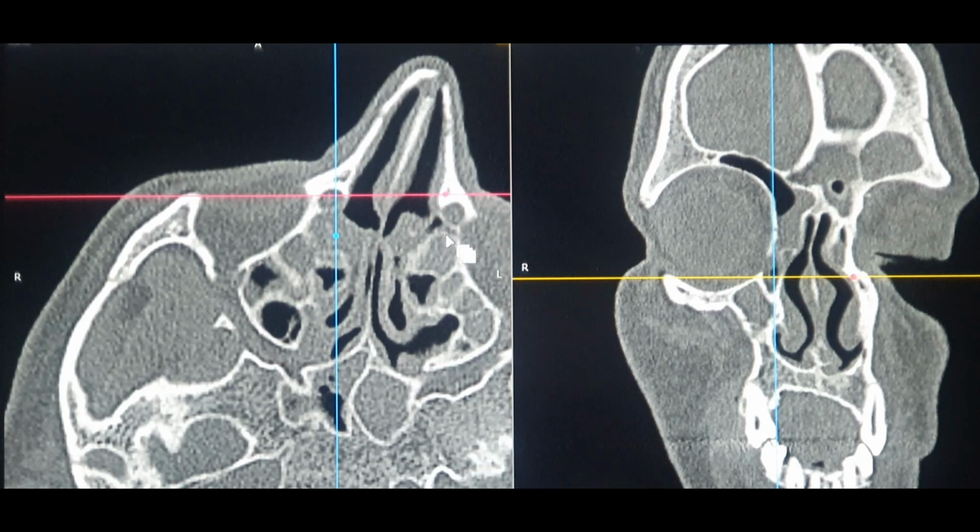So this is how the anatomy of the nasolacrimal duct system, the bony apparatus, the lacrimal fossa, can be studied on the axial scan. So this was the thing about the NLD. So the first thing was to always locate the frontal sinus. The second thing is to locate the frontonasal process of maxilla, for locating the nasolacrimal duct. That was the second most important thing.